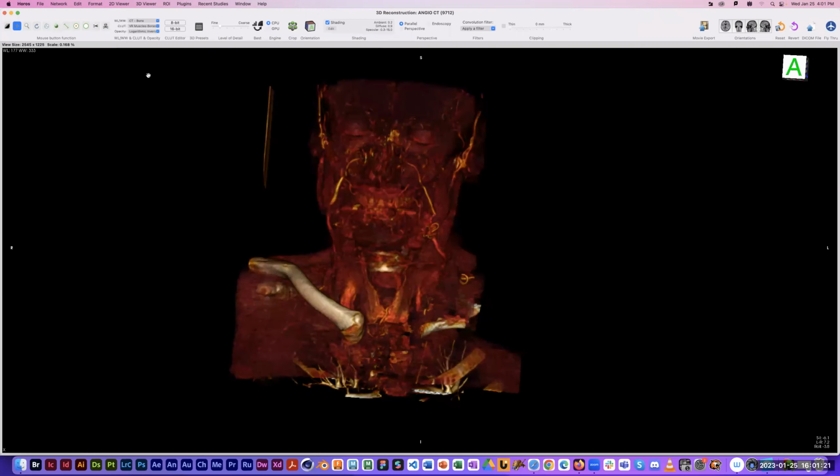Are you in the one with the visible view data set, this one here? Yeah, so when you come in here, don't click down below on next. Just click on this thing here.